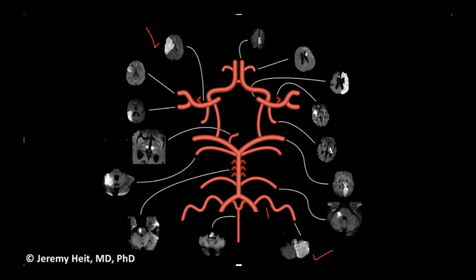It's the PICA. Let me look at Ashley first real quick. So it is the PICA, right? So the PICA is coming out of the vertebral artery. So what is the syndrome associated with PICA that you guys get excited about? Wallenberg. Right. Okay. So now that I gave away, you're not only looking at the MRI, but you're also looking at the circle of Willis. So quickly you can always check. But I want you guys to remember this. That's why I'm asking you.